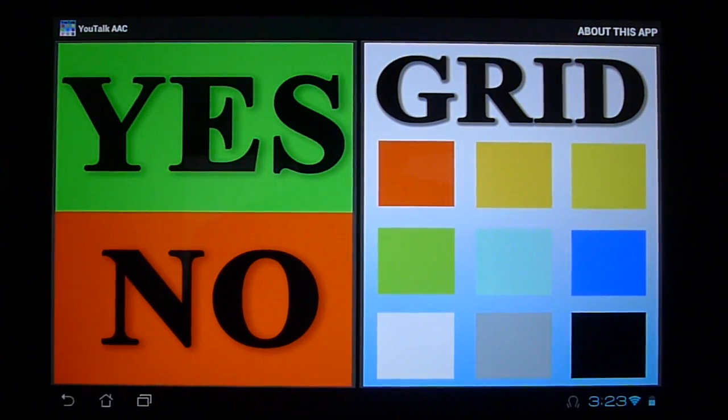So I hope that was a good overview of the application. We're going to have some mini tutorials in this playlist, much smaller, on things like how to configure a tile, deleting a tile, getting pictures from the computer and putting them onto the tablet, or saving a picture from the tablet's browser. So we're going to get into that afterwards.